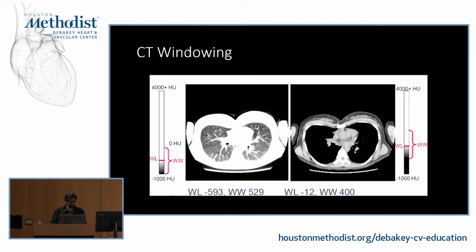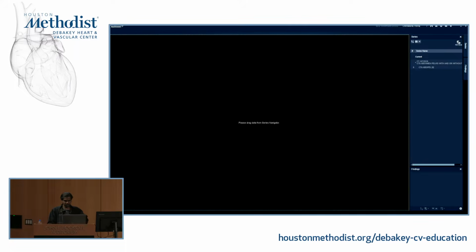Let's take one case example. I'm going to review an EVAR case here. Let's go through the images, and I'll come back to these individual sequences of how to do it. This is just a basic multiplanar view. What you see in the PACS is just axial images.